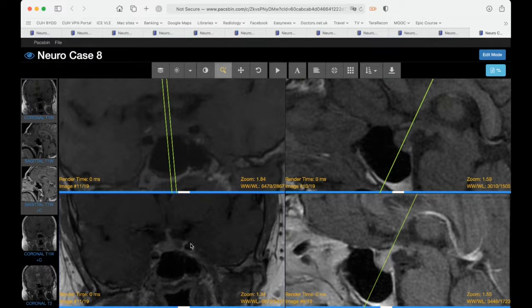So is this a histiocytosis, like a Langerhans cell histiocytosis, for example? An inflammation of the pituitary gland, a hypophysitis? Is it a MET from their renal cell cancer and they're known to have metastatic disease? Is it something more unusual like sarcoid, just coincidental, or TB, which are classic causes of pituitary stalk thickening and enhancement?